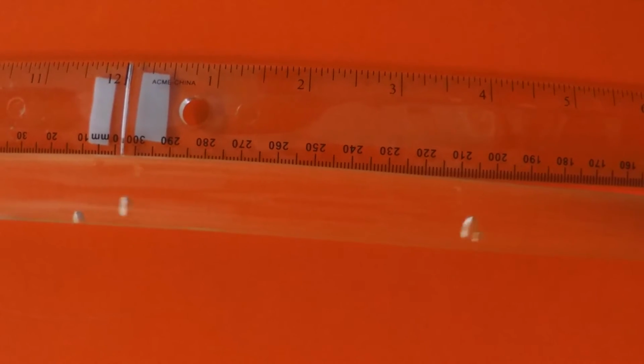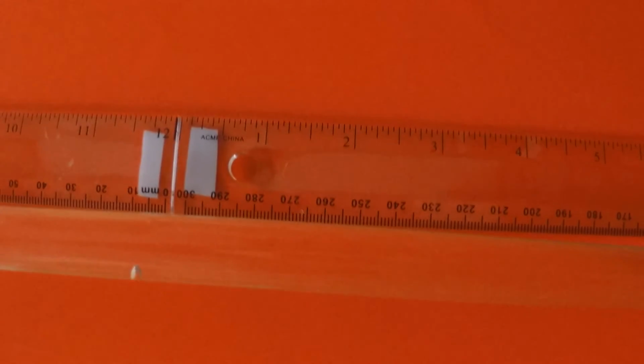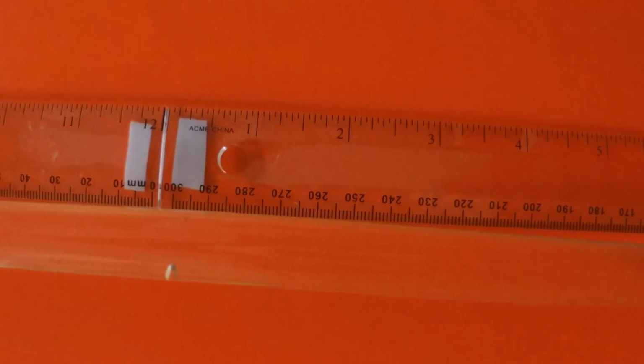Finally, watch the large 2,300 micron bubble highlighted by the arrow as it first changes shape and then becomes detached from the wall before a uniform bolus in excess of 13,000 microns passes down the half-inch tubing at 3.1 liters per minute.